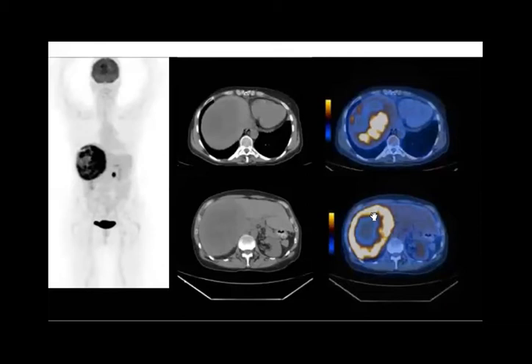And now you will think, is it a primary tumor or is it secondary? Do you think that maybe it is an HCC in this patient with a cirrhotic liver, or is it metastasis? It will be a differential, but they mentioned that this patient was proved to be HCC. Yeah. Okay. And the colon was just diverticulitis. Yeah. And you can see the appearance here. Okay.